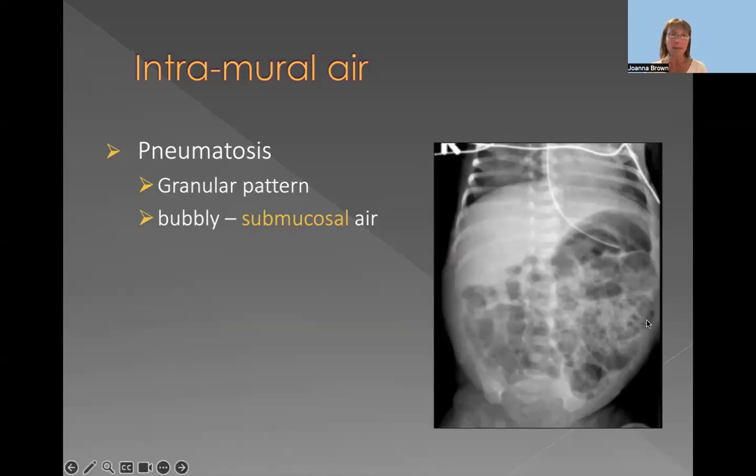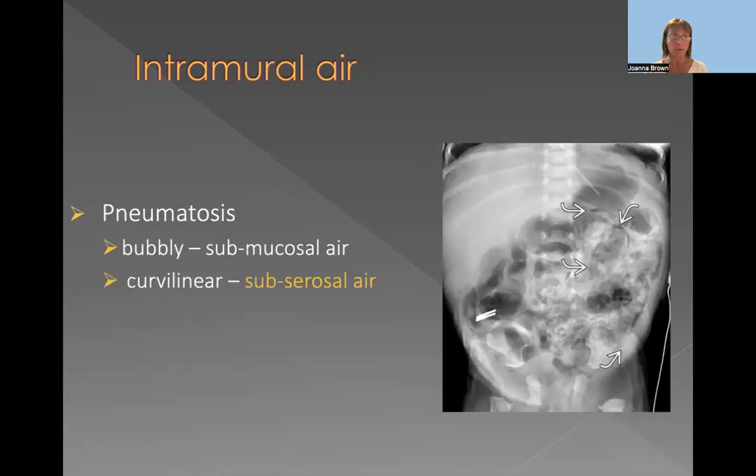If we have a bubbly pattern, like you can see here with multiple small pockets of air, then it means that the air is positioned within the submucosa.